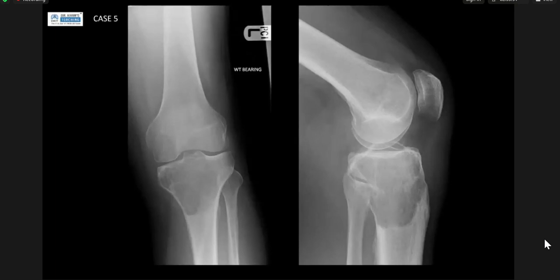I'm sorry, you cut out. Aggressive or non-aggressive? Aggressive. I think we'll go with aggressive. Okay, what in particular are the features that you're citing for it being an aggressive lesion? An aggressive bony lesion usually has a wide zone of transition. I usually have a marked periosteal reaction. I see if there's a soft tissue mass or swelling considered for the pathology.